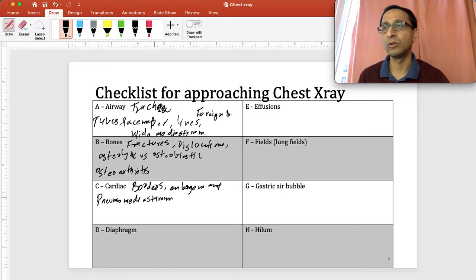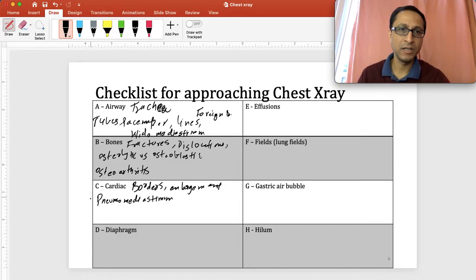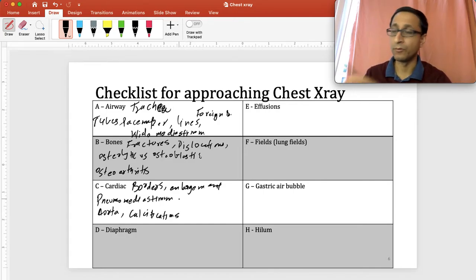At this point, you can also look for the aorta, any widening, any tortuosity. So those go in hand, aorta. You can also look for any calcifications on the valves. Calcifications, right? So either in the aortic valve, mitral valve, any of those. At this point, you can also look for, if you have not already done so, SVC, IVC, any of those.